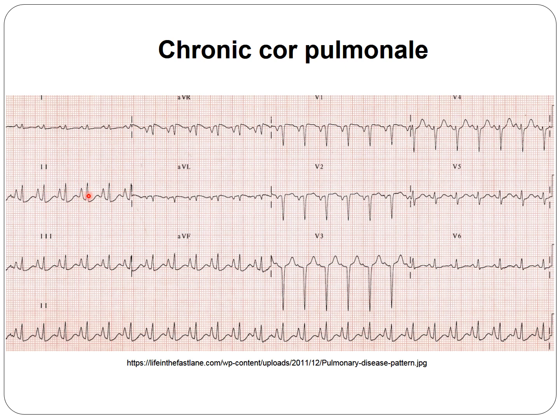Pathological Q wave, it looks like we do have a QS complex in V1, V2, V3. However, we do have very weak R wave progression and low voltage in the chest leads, representing chronic cor pulmonale. So this QS complex from V1 to V3 is not a sign of necrosis. This is usually due to the displacement of the diaphragm and the rotation of the heart.